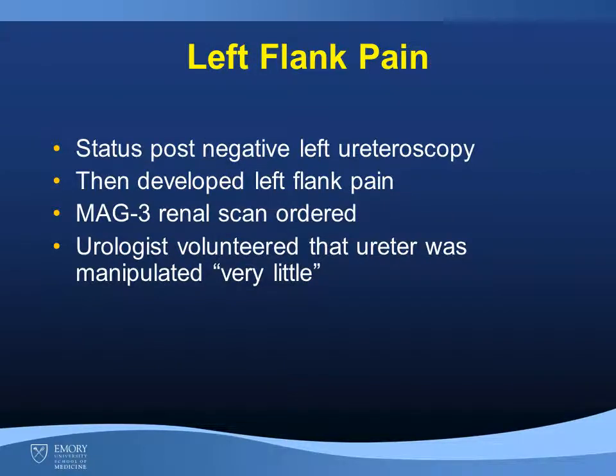Let's look at another case of a patient with left flank pain. The patient is status post negative left ureteroscopy, then developed left flank pain. MAG3 renal scan was ordered. The urologist sort of volunteered on his own that the ureter was manipulated only very little.